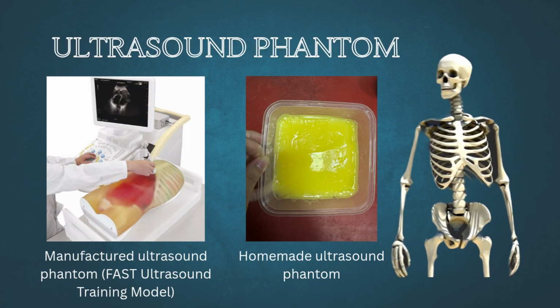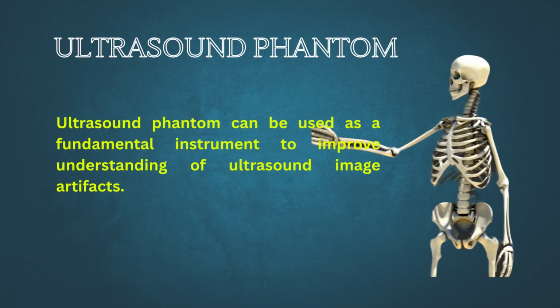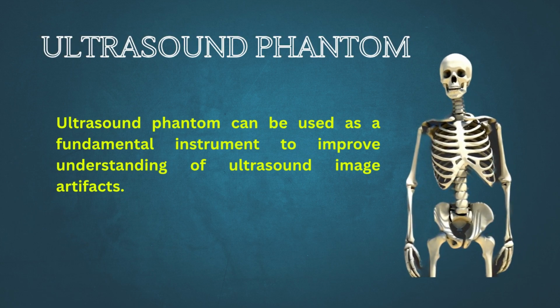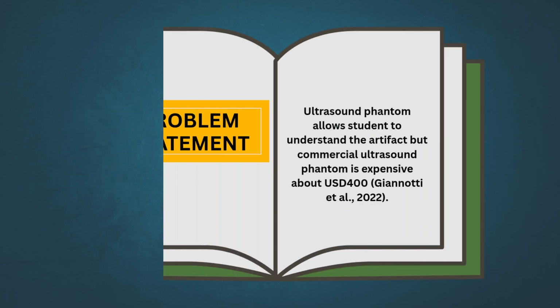Ultrasound phantom design can be found either commercially manufactured or handmade. An ultrasound phantom can be used as a fundamental instrument to improve understanding of ultrasound image artifacts. Its role can be improved specifically to demonstrate ultrasound artifacts that usually appear in diagnostic medical ultrasound images.